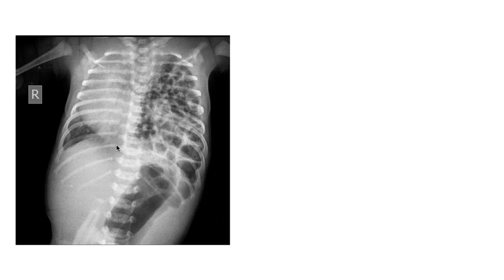So this is slightly difficult. Take your time. You can pause the video. So what is there in this X-ray? Again, yes, mediastinum is shifted towards the right side. So the whole of the cardiac structure you can see is going to the right side. Trachea is towards the right side. What is there in the X-rays? How will you describe these?